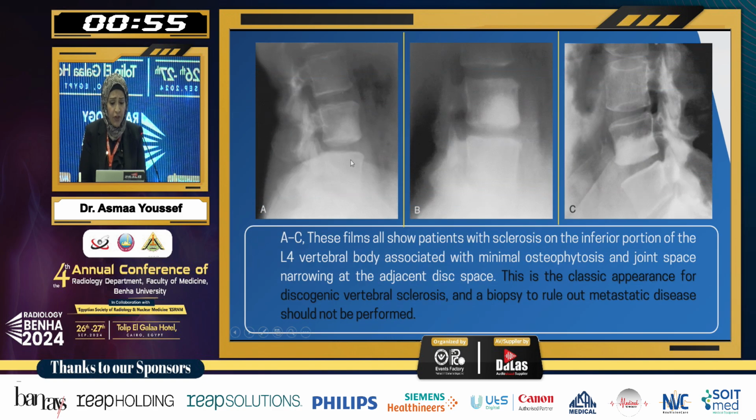As we see here, these films all show sclerosis on the inferior portion of the L4 vertebral body with associated minimal osteophytes and adjacent disc space narrowing. This is a classic appearance for discogenic vertebral sclerosis, and a biopsy to rule out metastatic disease shouldn't be performed.